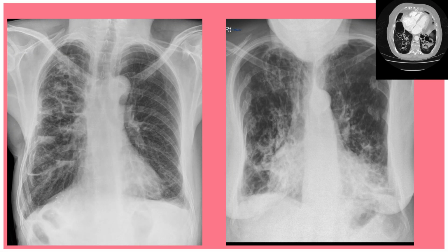And here we go with other cases, especially for patients with lung cysts. So we're going to start with the right image where we have hyperinflated lungs with some multiple thin-walled cystic spaces in the right lung, and several have air fluid levels in the dependent position.